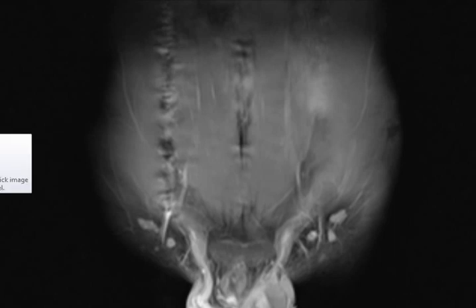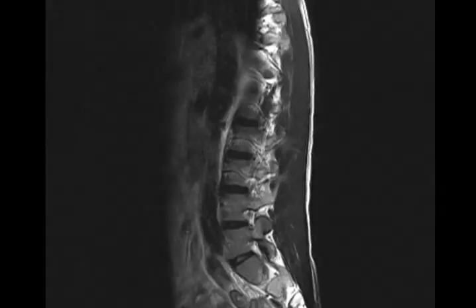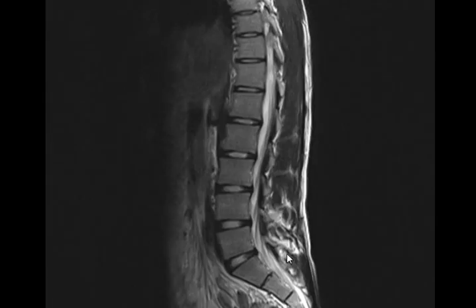So what was imaged is the LSS and the hip. The LSS was normal, so our problem is with the hip. See, and tell me what you think, and tell me what you need, and do the whole thing, okay? The LSS is normal, don't waste your time with it. Check it, no problem. And by the way, in the hip, they did a hip MRI with contrast.